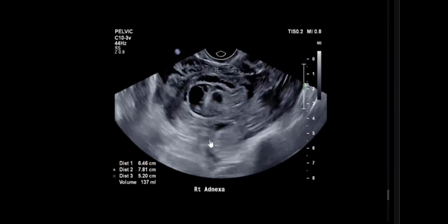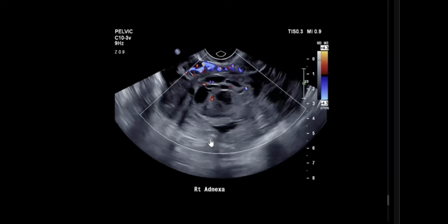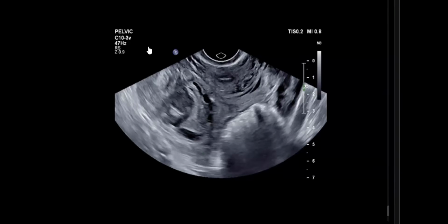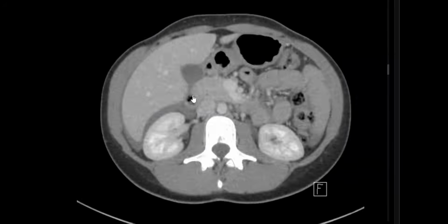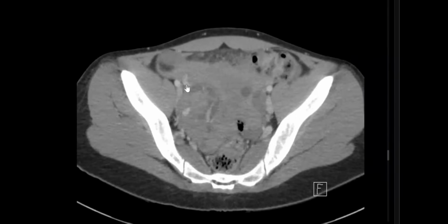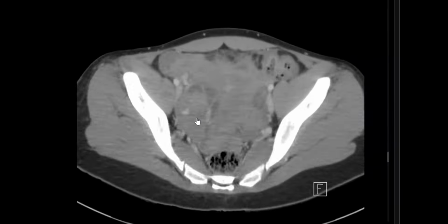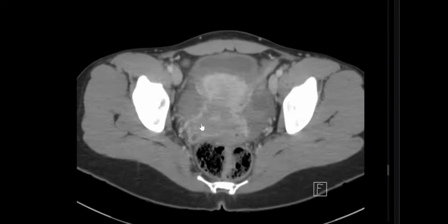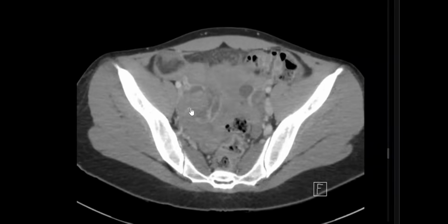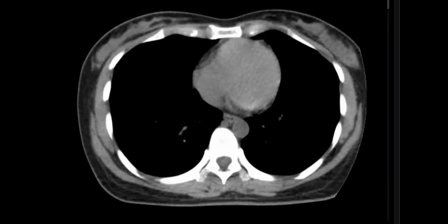It's very common in practice. My specialty is ultrasound and Doppler, so I see it every week. Disturbed ectopic and hemorrhagic ovarian cyst are the main differential. Again, on a CT scan, in my routine practice, I will comment on the pre-contrast study. Why? I will look for any hyperdensity, which represents hemorrhage. You see, this area is definitely abnormal, and as you mentioned, it's right-sided areas of extravasation, and this is the normal leftover. So it's a gynecological emergency.